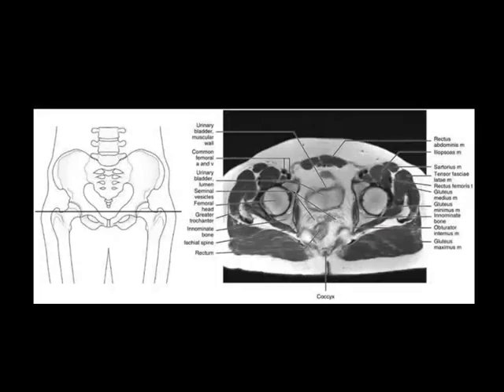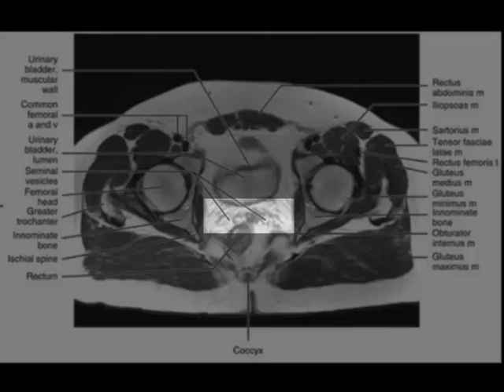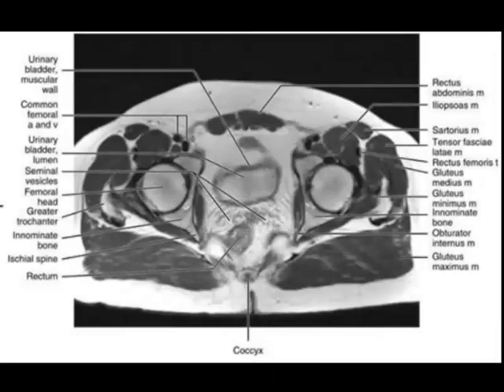This is an axial MR image of the male pelvis. The urinary bladder is again the most notable structure at this level. Just posterior to it are some darker gray, irregular shaped structures. These are the seminal vesicles. Also the rectum, which is seen here, again, that is the most posterior visceral structure.